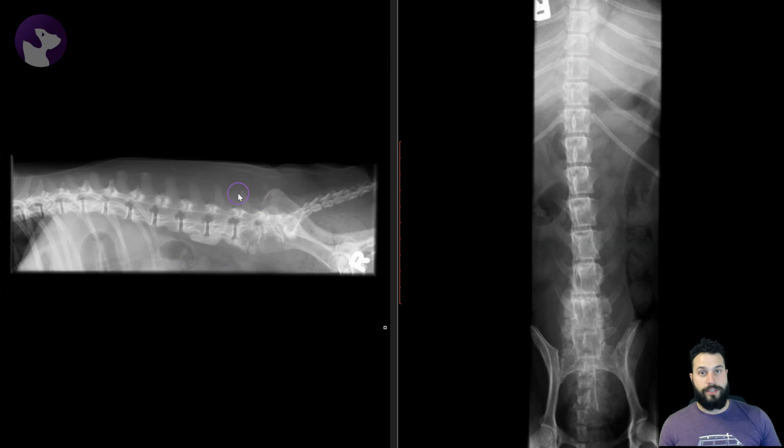So these are nice radiographs collimated to the spine. This is a really important feature of radiography of our vertebrae. We need to be taking collimated radiographs to really improve our radiographic quality. And so that's what we did in this instance. Took these nice collimated spinal radiographs. Patient was really heavily sedated for these to try to get as straight as possible.